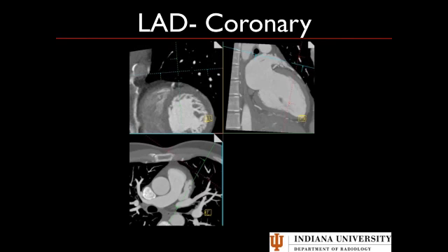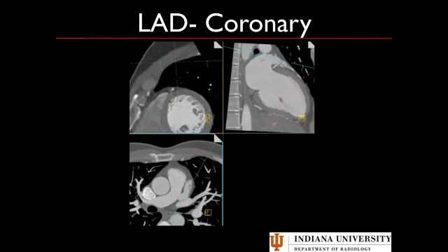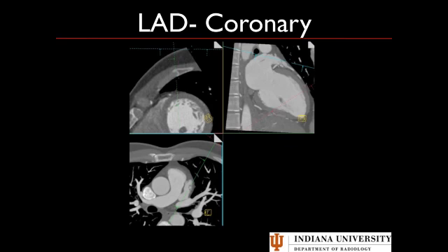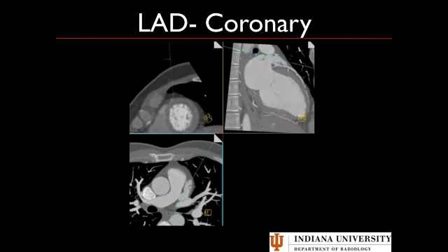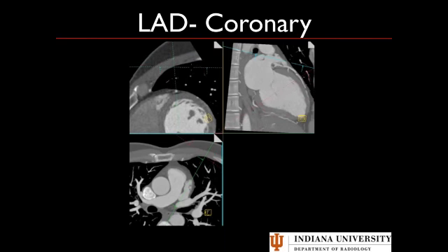The other thing is you want to be careful on evaluating stenosis with thin MIPs. If there is a significant stenosis on a thin MIP, you're fine. However, you can underestimate a stenosis using thin MIPs. If you remember, the plaques are generally always eccentric, so your thin MIPs are only going to show you the bright contrast. If you've got a non-calcified plaque, you can very easily miss this with thin MIPs because it's going to be overshadowed by the dense contrast within the vessel. So be careful with thin MIPs. You can actually underestimate a stenosis.